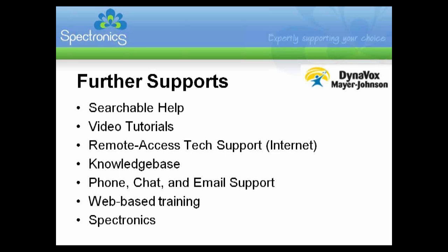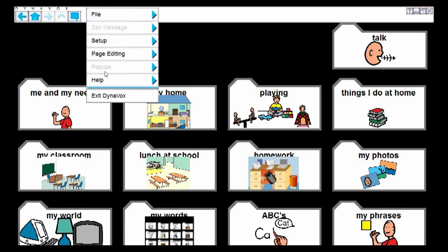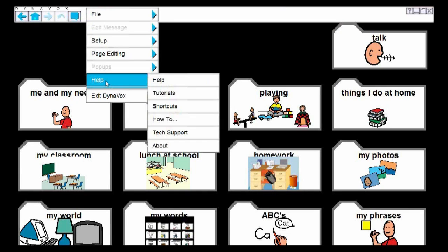The first thing I'll show you is back in the software itself. There are a number of supports built in. If we go into our menu at the top and choose Help, there are the Help topics that you can go into.